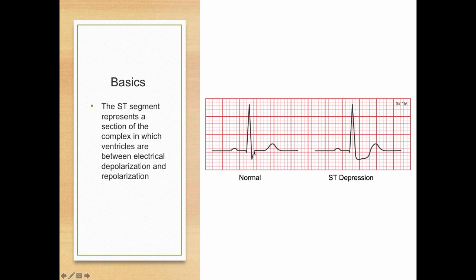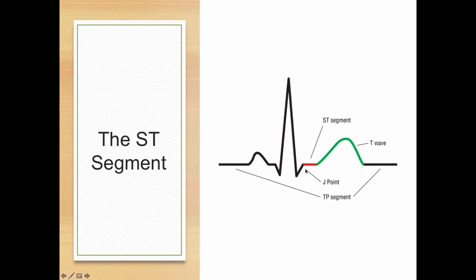Normally the ST segment should go back to baseline. Sometimes we've got some depression, and later on we'll talk about ST elevation. So the ST segment should be at baseline, but it could be lower than that, could be depressed, could be higher than that, could be elevated. There's our ST segment there in red.